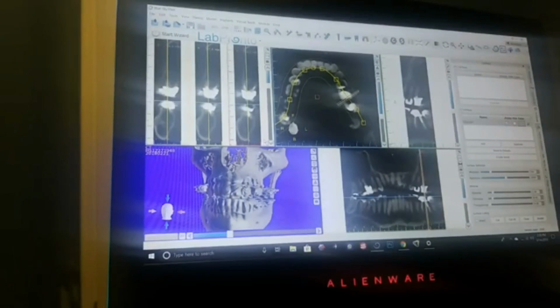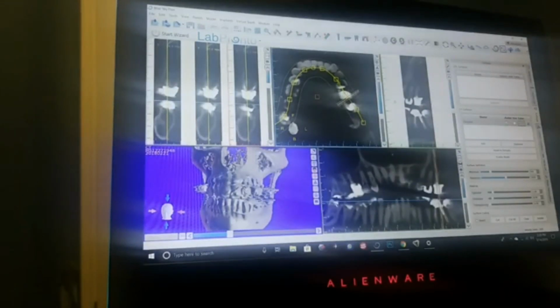Now, the other image that you need to pay attention to is, and it's going to be very hard for you to actually see, there is a very light blue line that's running here. This one you could see actually, okay? This blue line that you're looking at in this image down here corresponds to, if it's very difficult to see, the numbers that are on the axial image on the bottom and on the side.